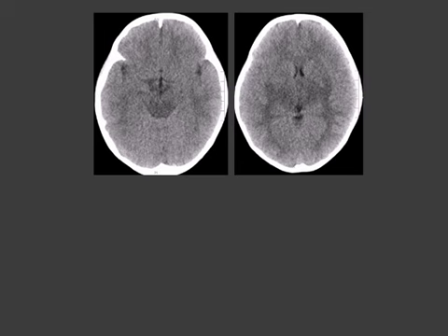Maybe normal because it was bilateral hypodensity. If something is bilateral in the brain, usually it appears like it would be normal. We are always looking for asymmetry. But still, even if you miss this hypodensity of a thalamic region, you shouldn't miss this hypodensity of the midbrain.